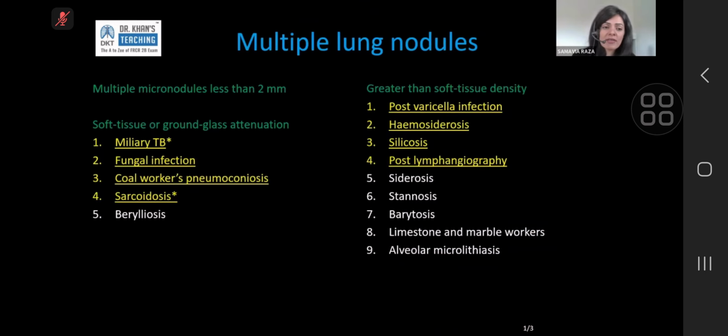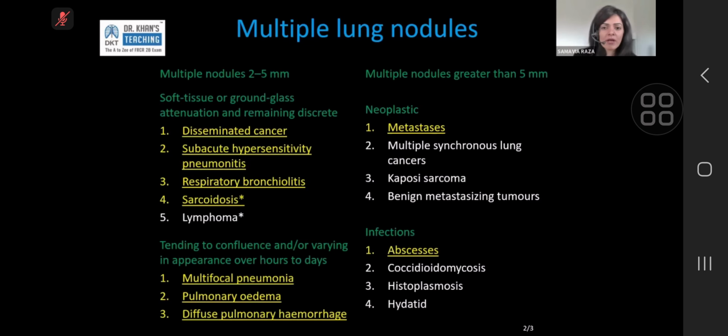Multiple lung nodules are slightly more varied. For the differential, the attenuation in multiple lung nodules is the main focus, between solid and ground glass, because the ground glass multiple lung nodule differential is very different, and the most important differentials for those are almost all non-malignant, whereas solid or calcified multiple lung nodules have a slightly different distribution. We don't need to go through all of these, but this is just to put it into context in the back of your mind.